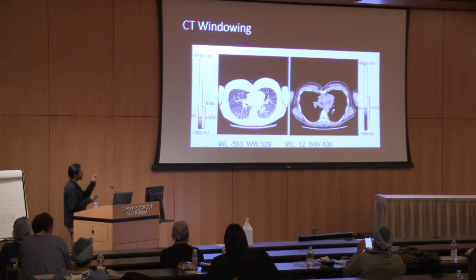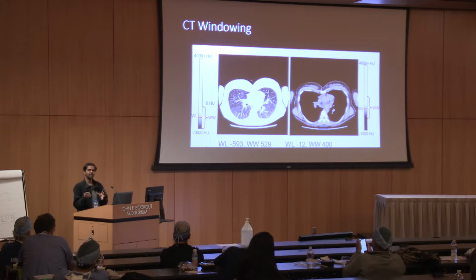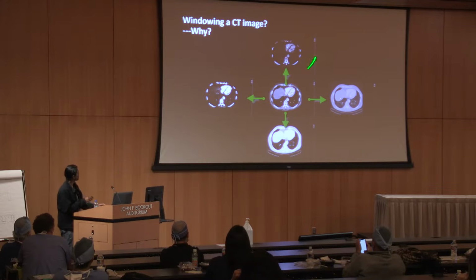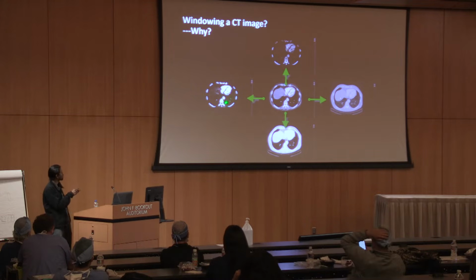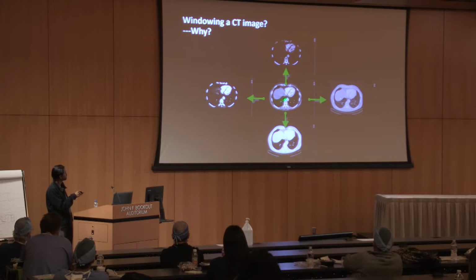This is something that you have to be absolutely clear on in concept, and when you are manipulating the CT images, you have to pay attention to this. Why do I say that? If you go back to this picture, and say the patient has a thrombus in the aorta, and you are looking at it in a window value like this, there is a chance you might miss the thrombus because this image is not really windowed for the low attenuation values that you would see here.